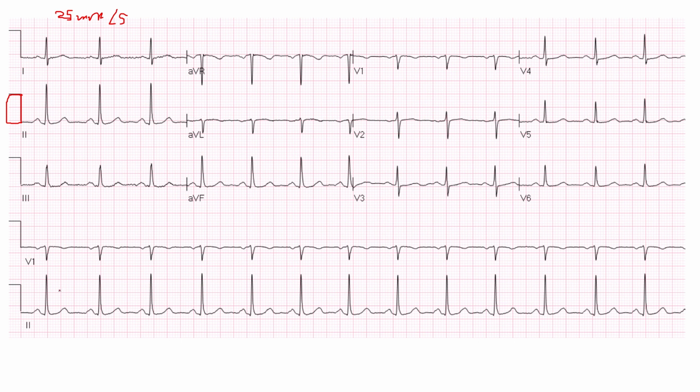Let's check. Always take lead 2 and take the one that has a long strip. Okay, for example, this one, the RR interval is 4 large boxes. This one is also 4. Actually, this is not 4, this is 3 and almost 4. This one also the same. If you count it, for example, from the tips, it's almost the same. Let's count this one also, 3 and also almost 4. So in small boxes, it will be around 19 small boxes, all of them 19. So in this case, we can say it's regular. So we decided it's regular.